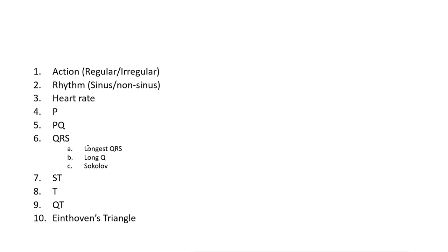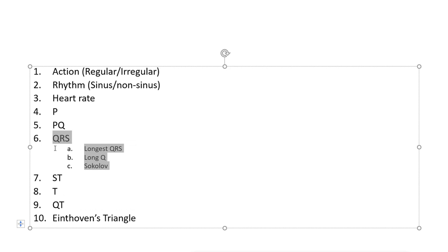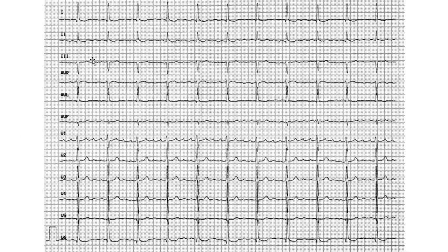I'll leave these points to you if you would like to do them, but for time's sake, and also because this is not the goal right now. The goal of the seminar is to highlight the game-breaking mistakes. So, next up: you can take a few seconds if you'd like to try it. I'll give you 3 seconds, or you can have as long as you would like, because you can pause. So, 3, 2, 1, let's go.